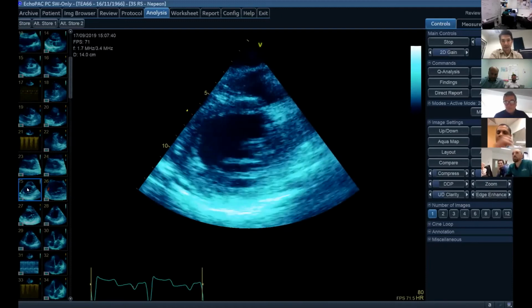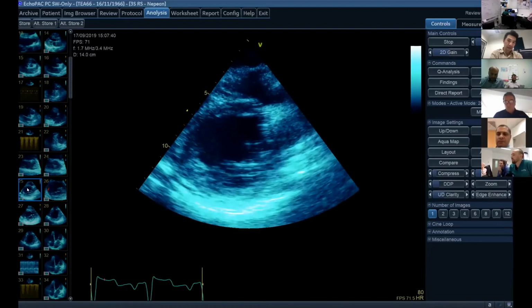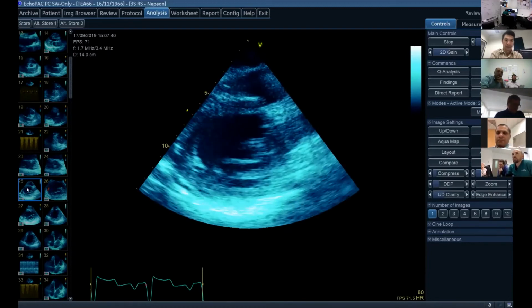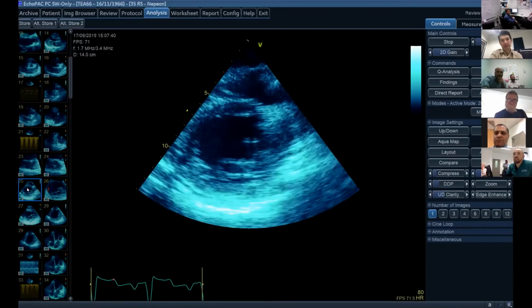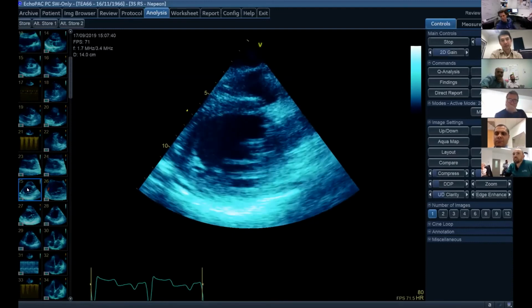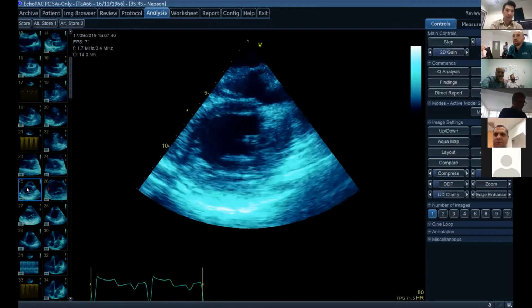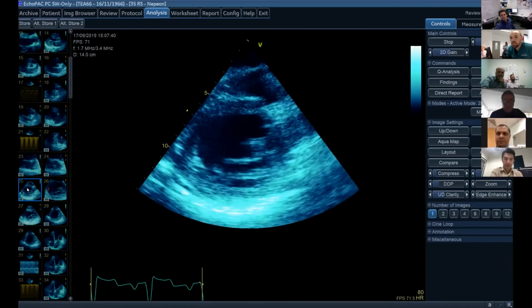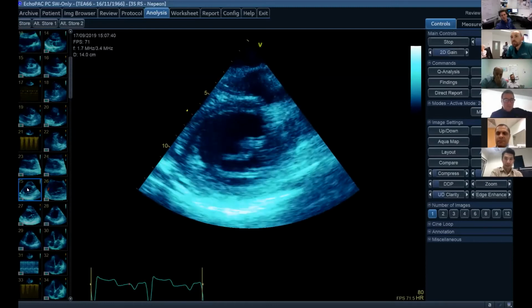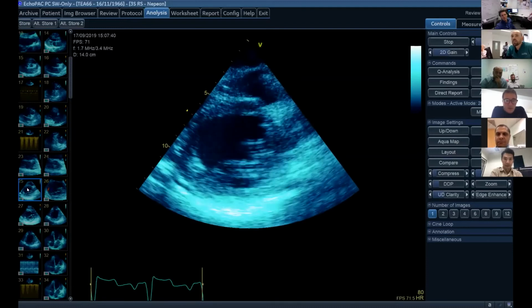Danielle, do you just want to describe these short axis pictures in terms of the grading system that we just discussed? Sorry, maybe she's not there. Carson, are you back online yet? Oh, you're on mute, I think. Yep, I'm back.